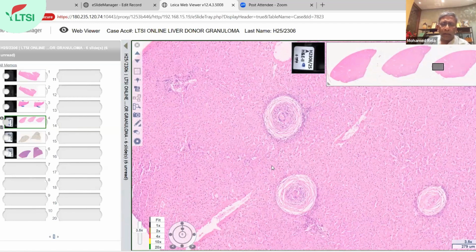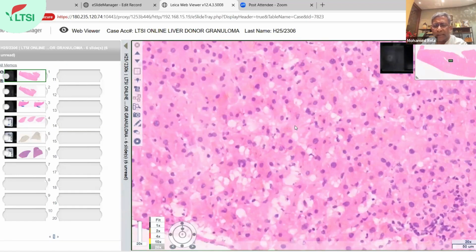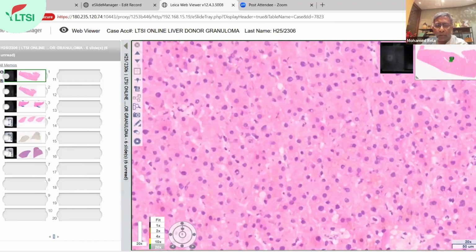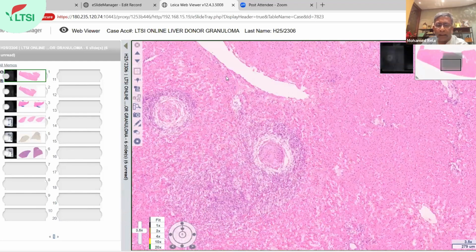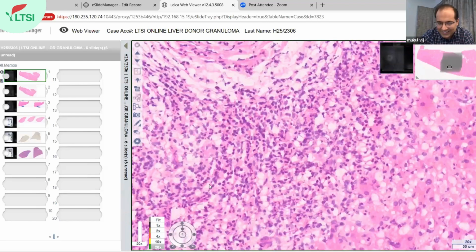Can you go back to the frozen section and show us eosinophils? I want people to be able to identify eosinophils, because for the pathologist it's such a basic thing. Pink in color is one thing, but the nucleus is segmented.